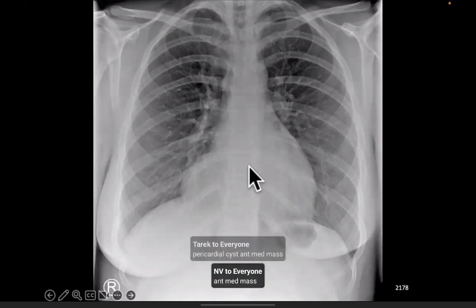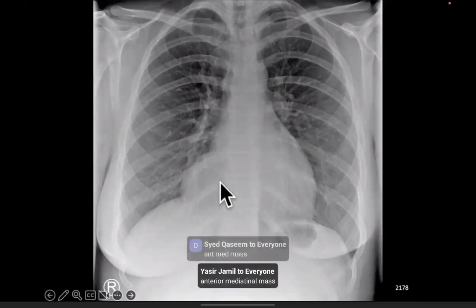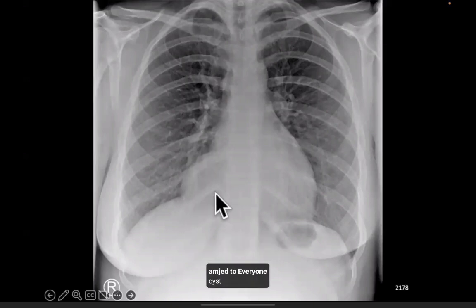Yeah, got an anterior mediastinal mass. Can't see the right heart border. We can see blood vessels running either in front of it or behind it. That's not that helpful, that low down. But we've lost the right hemidiaphragm anteriorly, probably, because this is obviously an anterior mediastinal mass.